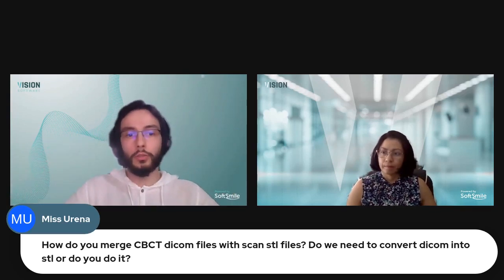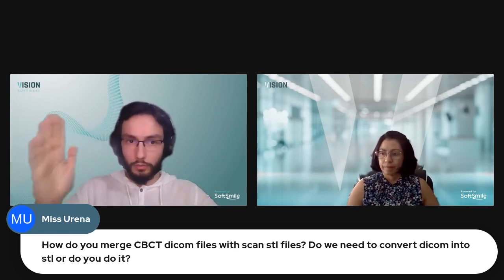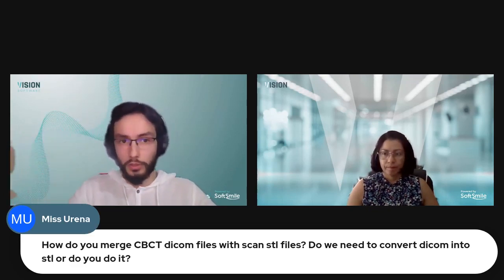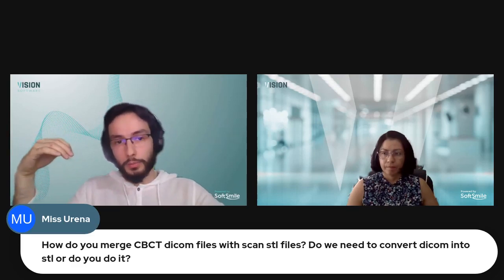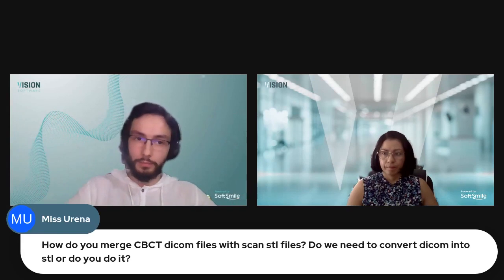So to answer your question, no, you don't need to do anything. You do your regular scan segmentation, just like Maria showed you with the points, with the contours, which is also automatic, and you upload your CBCT scans into the cloud. The rest happens automatically.